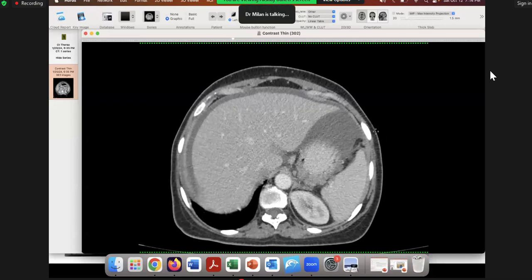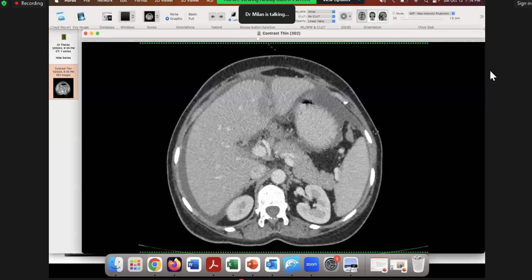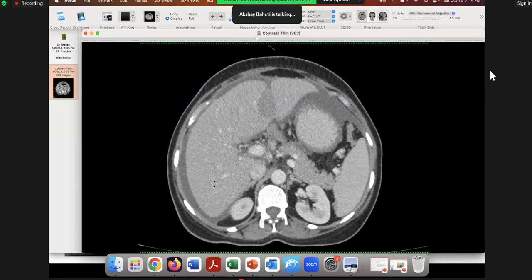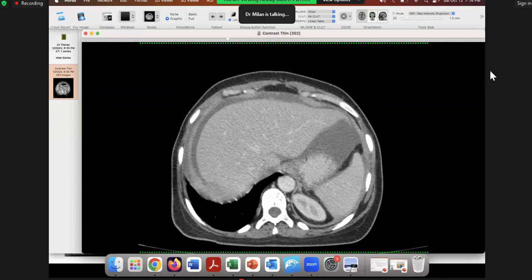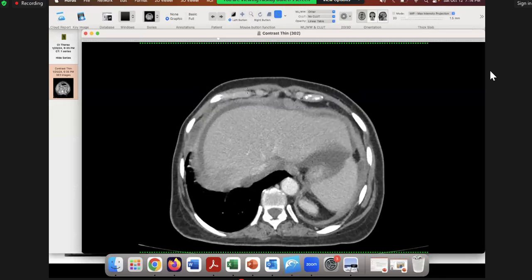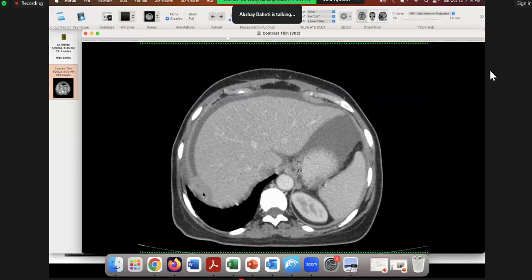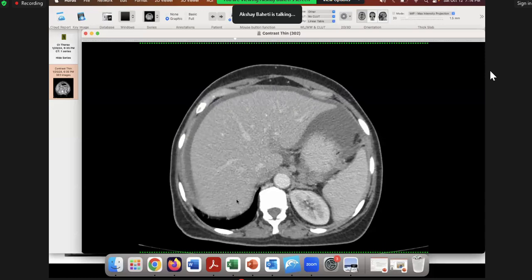Sir, on the hepatic surface, there are deposits. Excellent. So you see some deposits here, right? Subdiaphragmatic or hepatic, call them subdiaphragmatic. Fine. So certainly there are some deposits here. I hope it's something that everyone can see well. But there are certainly deposits here, and often you should do a coronal recon and you can see them better.